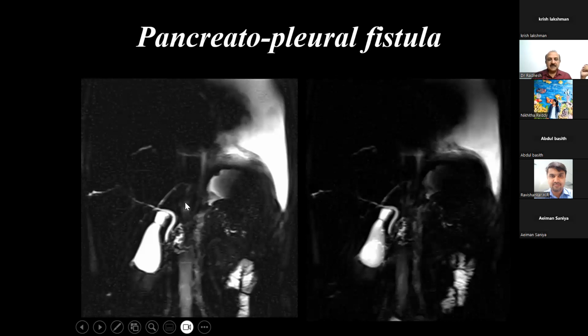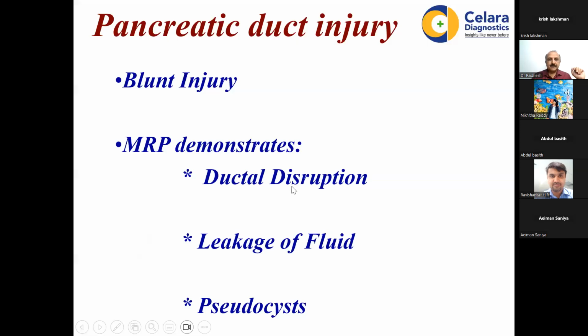So this is an MRCP image. It becomes very difficult for us even to identify the duct. I just brought this up not to discourage you from asking, but please look at MRCP images in the end. First look at T1 and T2 weighted and then the MRCP images.